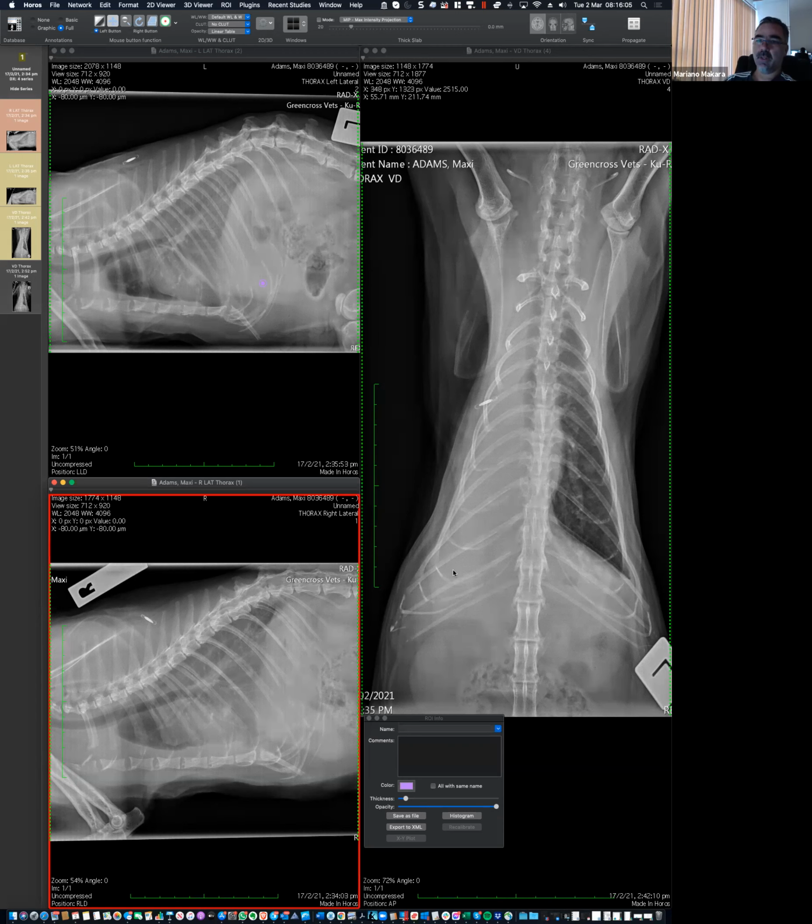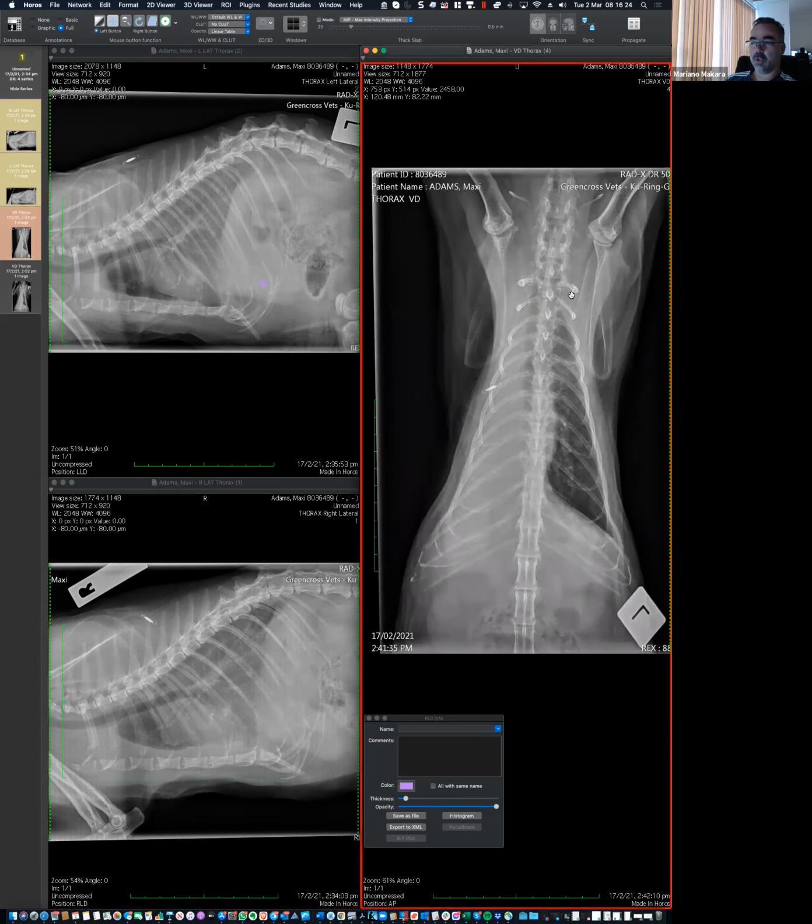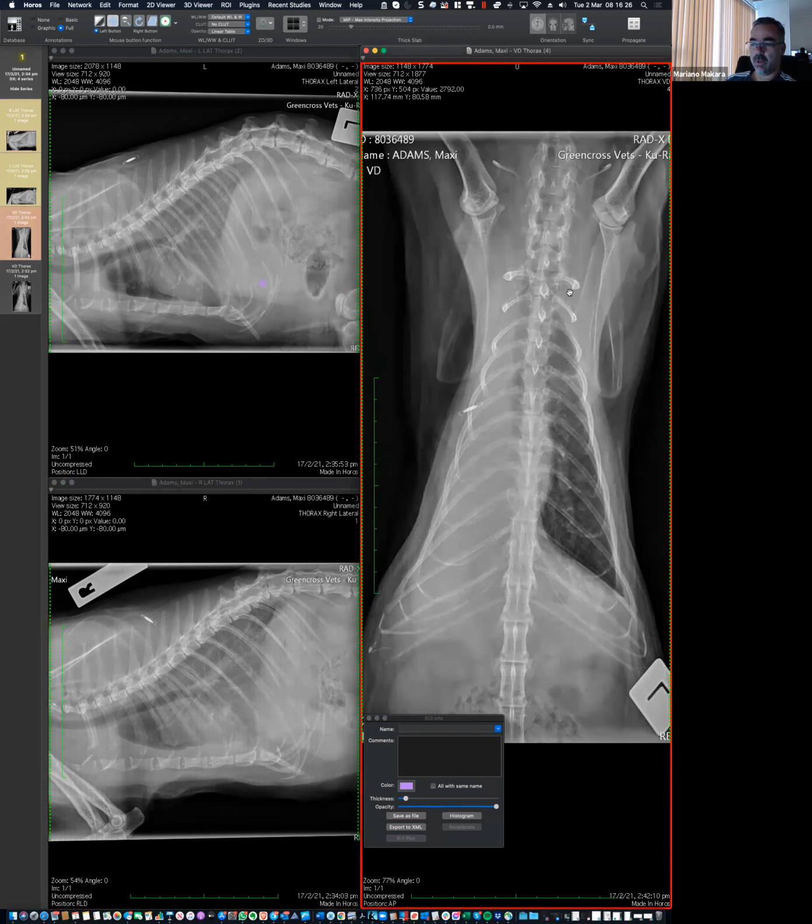I would sign that thinking aloud process. I would agree with everything. And again, it's not 100%. It's not that in every case the rule is going to be there, but the hints that you are pointing to are perfect. Now I'm not talking about the comment about the left cranial lung lobe, the separation of the lung from the wall in the left cranial thorax. Sorry.